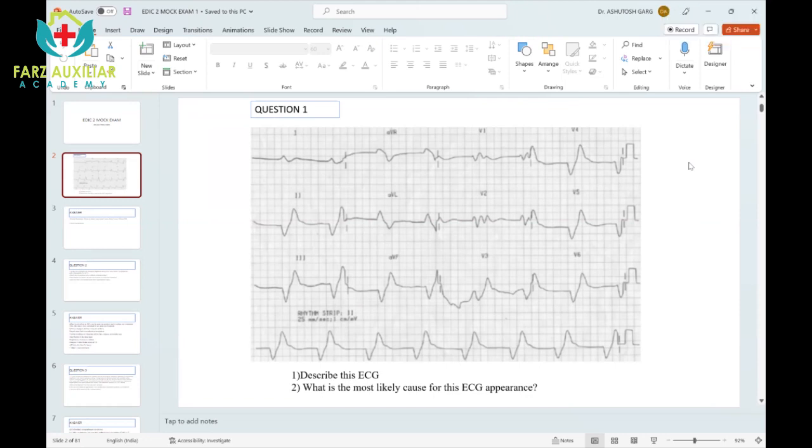It's a broad complex ventricular rhythm. Probably the patient had a heart block for which he has been paced, either a second degree. How can you see second degree block? Can you see the P wave here? No, sir, there are no P waves, but probably this is a paced rhythm.